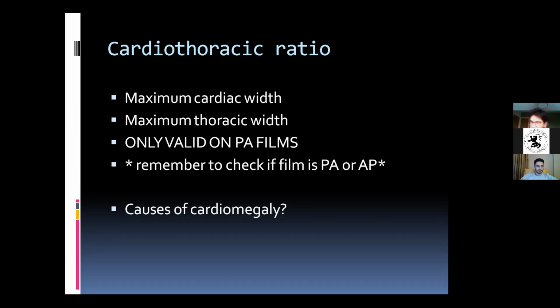Of course, any kind of cardiomyopathy, dilated cardiomyopathy, hypertrophic cardiomyopathy. All these can cause or will result in cardiomegaly. And remember, there's one thing that you should take away from evaluating the heart: always make sure that it is a PA film.